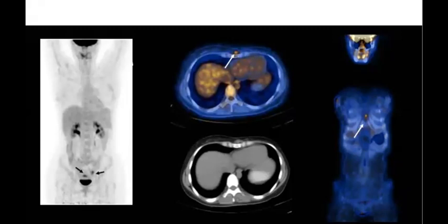And they like to show you this appearance. So is this physiological or pathological? The ideal answer that you can say to me is that it can be both. If it is pathological, you will go and check the axial images and see. But this one is physiological because sometimes the ovary and the uterus can have normal uptake.